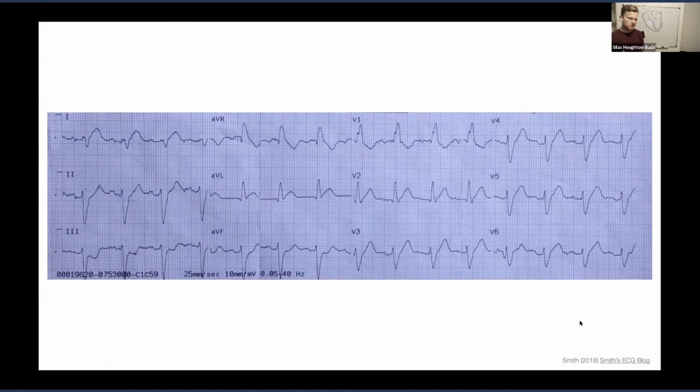And if we look at this ECG, the opposite occurs. The pattern in lead V1 is that small r followed by a big R. And this is a good example that shows that the S wave doesn't have to occur. So although an RSR complex is the classic view in V1 for a right bundle, sometimes you can just get this RR complex, but then with a negative T wave, which should occur in V1, 2, and 3.